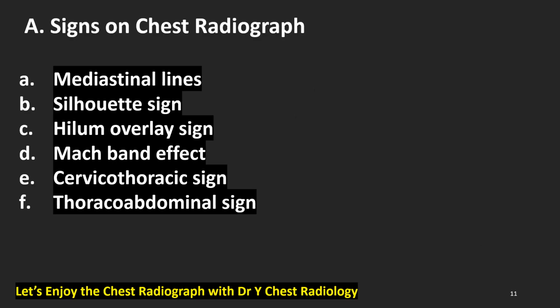To find mediastinal tumors on chest radiographs, especially the frontal PA view, we need to understand these concepts.